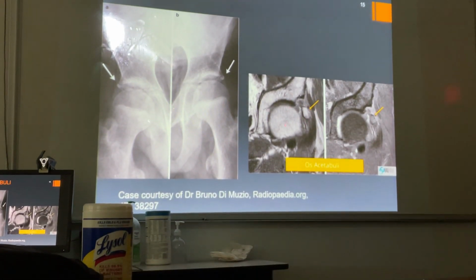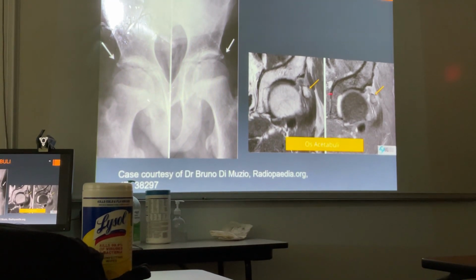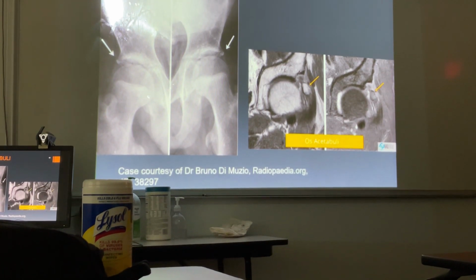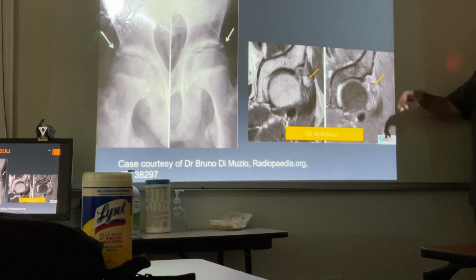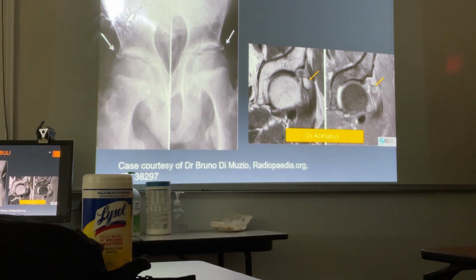Coronal, axial, or sagittal on this cut? Coronal, fat suppressed image. Now, when they get this large, okay, if the patient has hip pain, they're going to look at it from an arthroscopic perspective and say, does it have to come out? This one, the small one on the left, your left, leave it alone. The bigger, the greater is the likelihood that it's causing some kind of impingement or some kind of an issue. Okay, does that make sense?